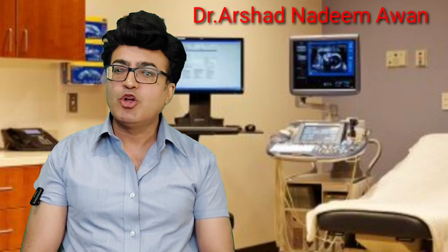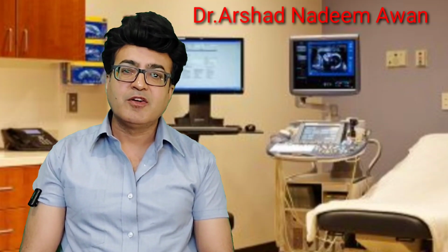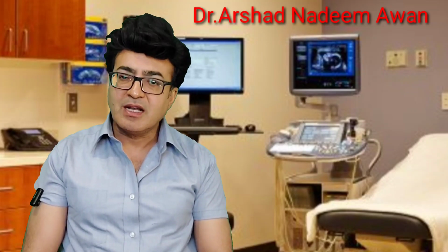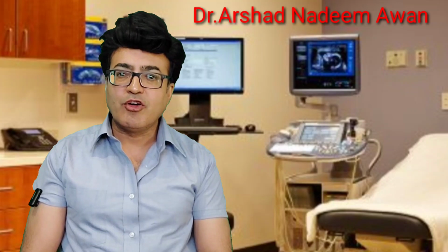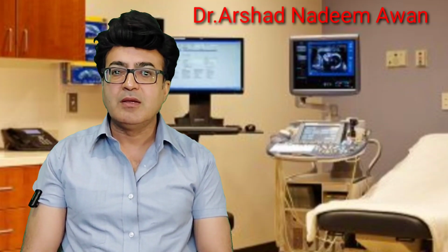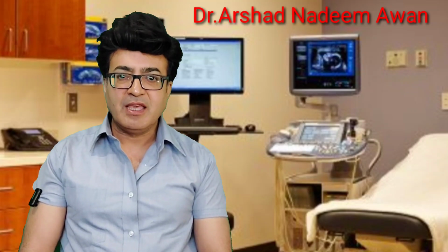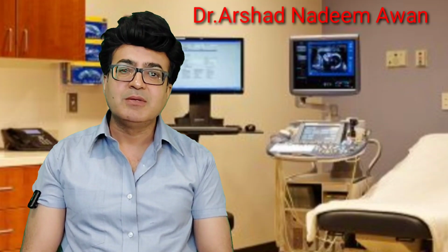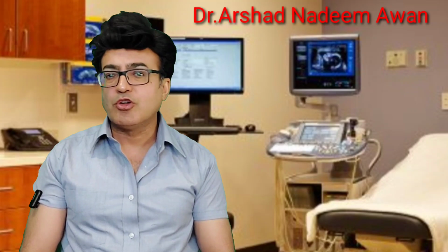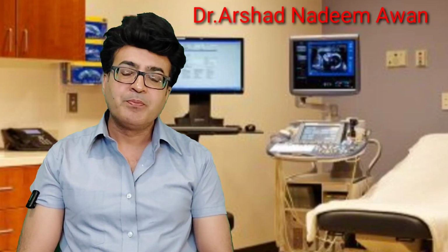As far as non-specific features are concerned, they are fluid within the endometrial cavity, or fluid in the cul-de-sac, or thickening of the endometrium. If there is thickened endometrium and fluid within the endometrium, it would rather be endometritis. But again, if inflammation of the endometrium is there, it would also be considered as PID. So these are all the non-specific signs, and you may put PID on your report as well.